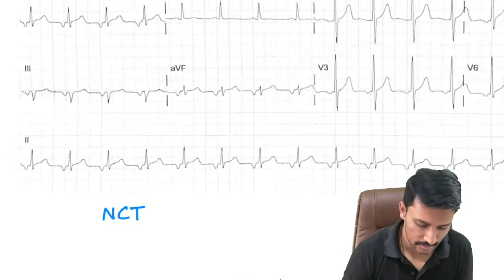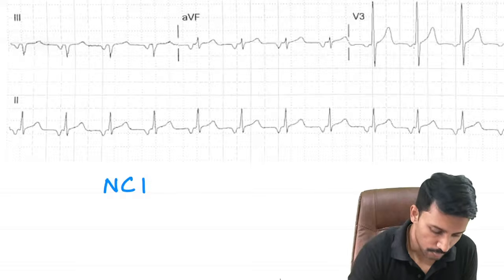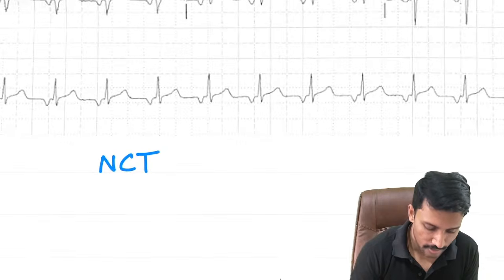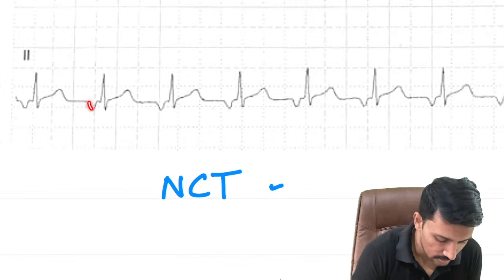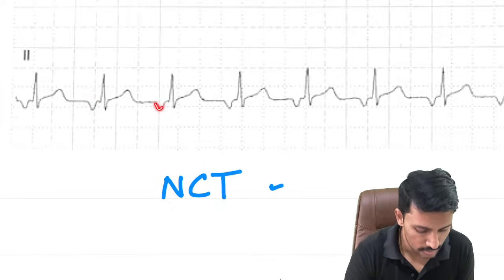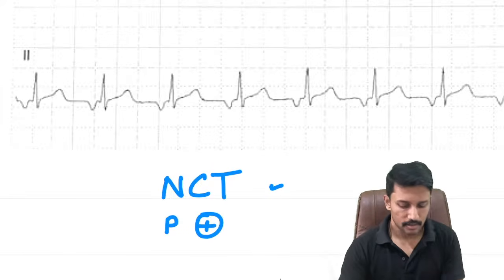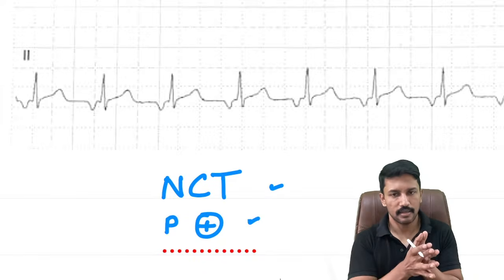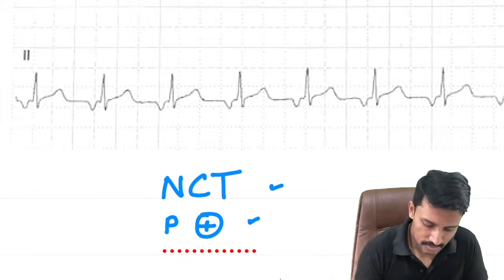This is the ECG that we were dealing with earlier. We concluded that this is not normal sinus rhythm because the P waves appear to be inverted, right? But we notice that the complexes are narrow, so we have to think of narrow complex tachycardias. And here I have a discrete, morphologically distinct, identifiable P wave, not in normal shape, but I can call this a P wave. So we will count it as P wave being present. When I have narrow complex tachycardia with P wave being present, I have atrial tachycardia and sinus tachycardia as my differentials, right? Now, what is it? We will decide.